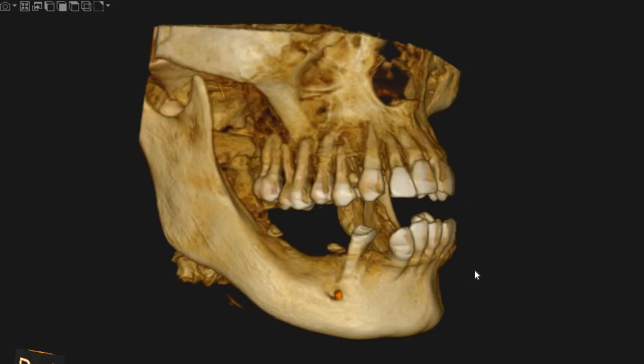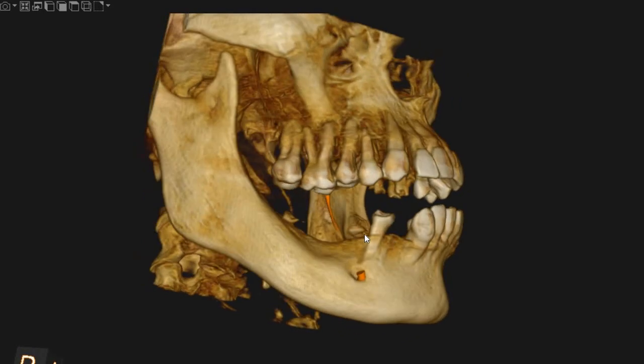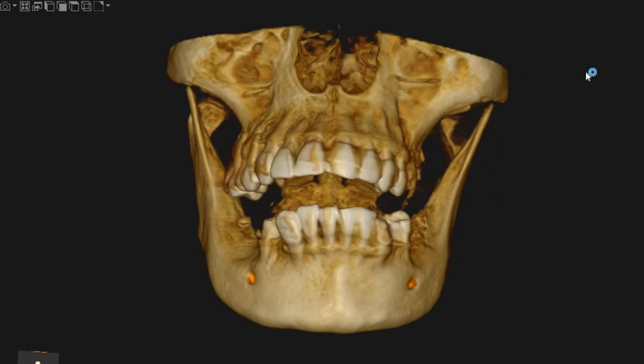This is the CBCT of the patient which you had requested. The area of interest is the upper right quadrant, lower right, upper left, and the lower left quadrant. Now, these are areas where implant placement is very difficult. Hence, what we've done is we've measured the ridges for our doctor, and then they can plan their treatments accordingly. We haven't placed implants because most of the ridges and areas or spaces will not be able to retain an implant unless bone augmentation is performed.